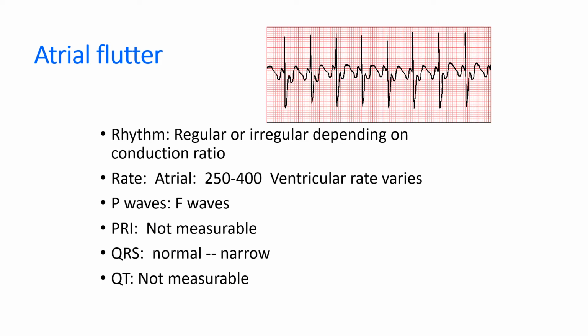The most common presentation of a new onset of atrial flutter is at a very fast rate, an atrial rate of 300 and a ventricular rate at least 150, if not more. This slide is an example of a fast heart rate at about 150. If you cover the top and the bottom, what you'll see is this continuous flutter pattern going on underneath. Those are flutter waves. It's much clearer if you slow it down. And there's another example with a strip in Huff on page 97.